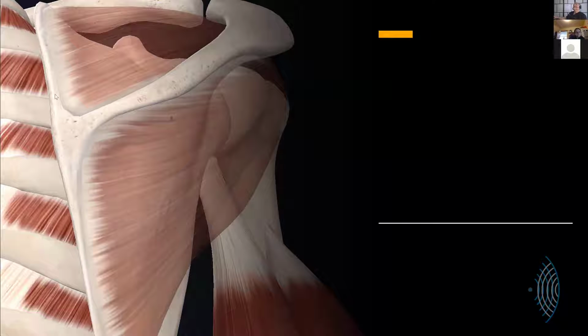Thank you, guys. This is the scapula. This is the spine of the scapula. This is the medial scapular border. And you know that at the end of the spine of the scapula is the acromion. And in the view, through a faded supraspinatus muscle, is the clavicle.